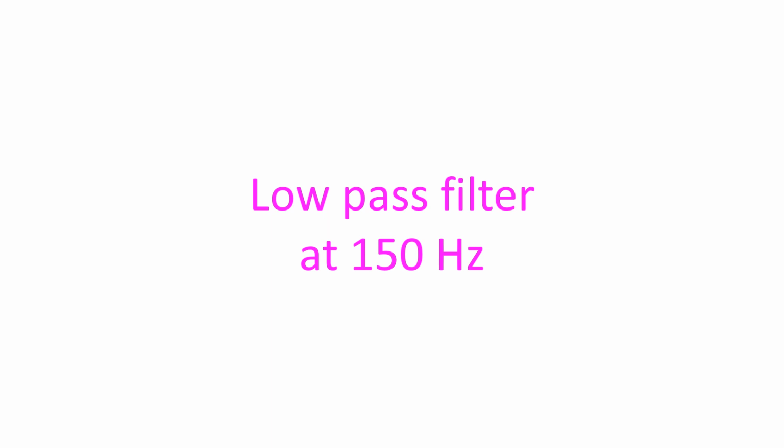It has been mentioned that setting the low-pass filter at 40 Hz may make the epsilon wave less prominent and reduce the chance of detection. A low-pass filter of 40 Hz is often seen in the default setting in ECG machines to remove artifacts due to myopotentials. Setting it at 150 Hz is useful to detect epsilon waves as well as most of the pacemaker artifacts, which also get attenuated with a low-pass filter at 40 Hz.